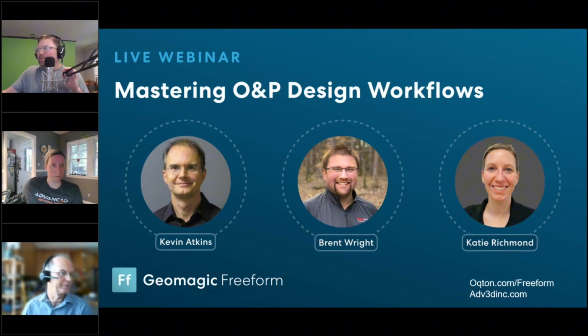Does Dynabot come with Freeform? It comes as standard with Freeform Plus at the moment. In the next version, we're going to enable the running of Dynabots in Freeform. There are two different versions of Freeform: Freeform and Freeform Plus. So in the next version, we're going to add the running of Dynabots in Freeform, but you'll still need Freeform Plus to write those Dynabots. And the other thing we're looking to add in the future is the ability to encrypt and lock Dynabots.